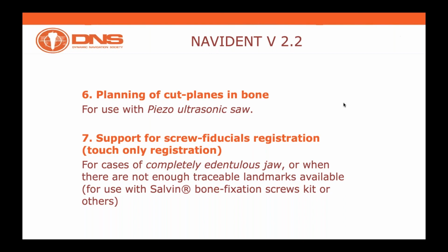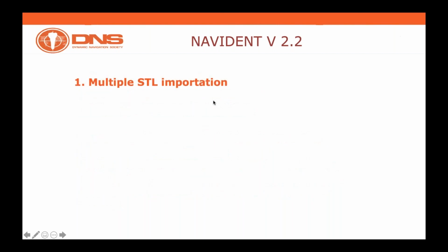So we will focus, therefore, on the first 5 items of changes. So let's start then with the first, which is multiple STL importation.